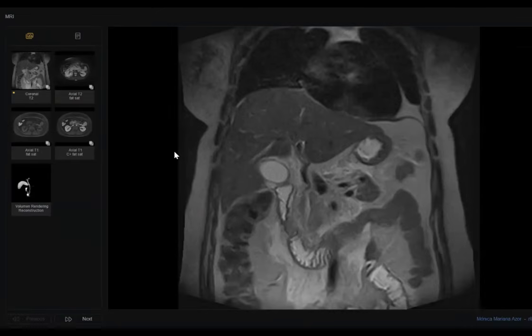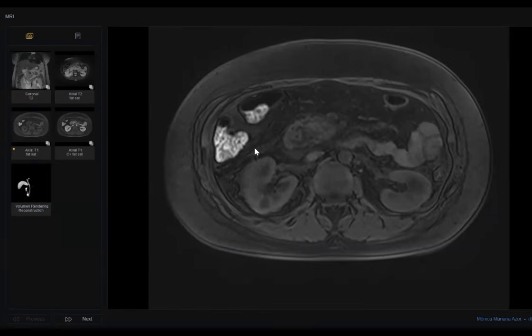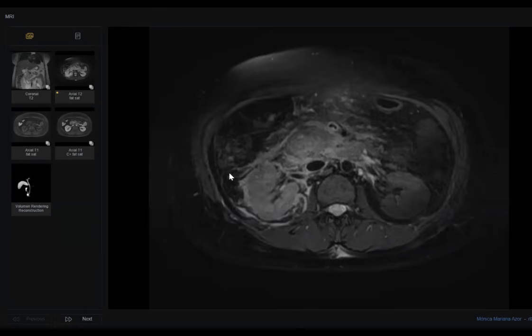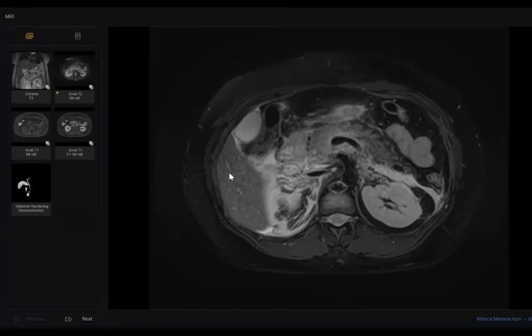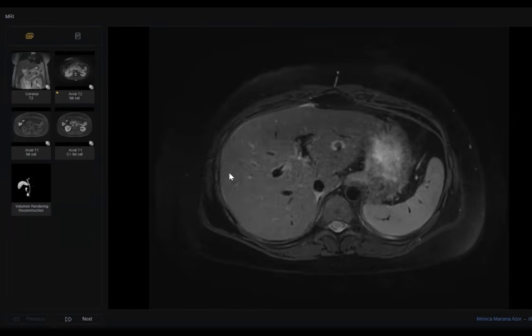Like you did, you look at the common bile duct, there is no obstruction and no stone. But what happened here? The first mistake you made was describing pancreatic divisum in T2. How come? Very difficult.